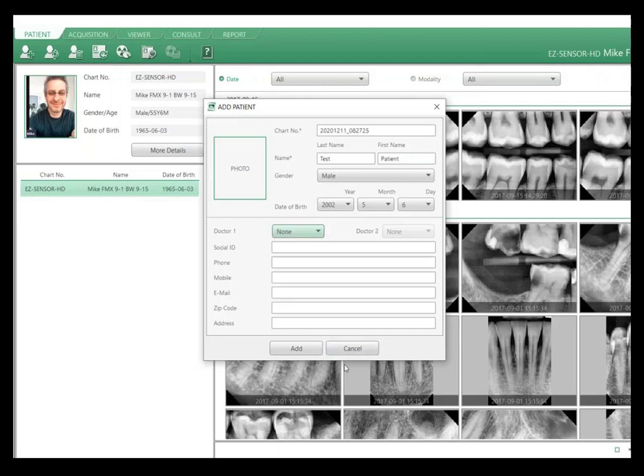Right. So perfect. And then one comment is, if you're linking from another practice management, oftentimes this can be auto-filled, where you'll go to your practice management software and it will automatically launch the EzDent-i, and actually the patient information may already be added in there. So different scenarios there. Paul, I think those were the only comments and questions that had come in specifically on what you covered so far.